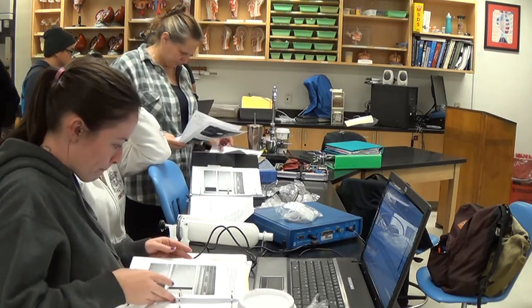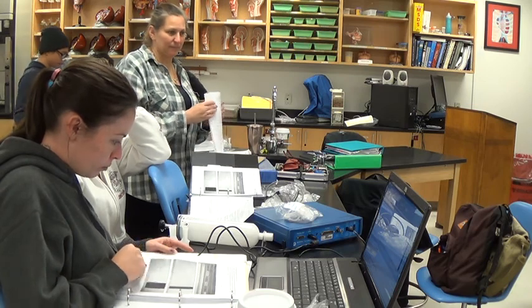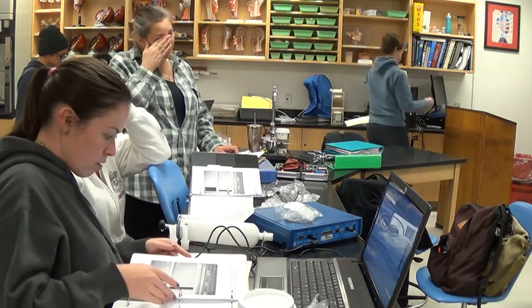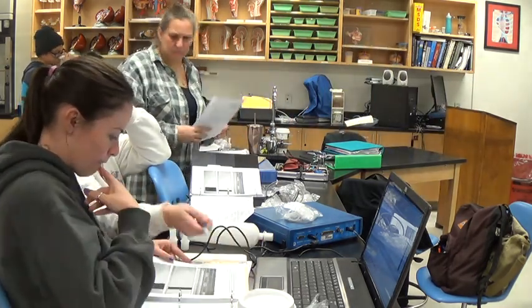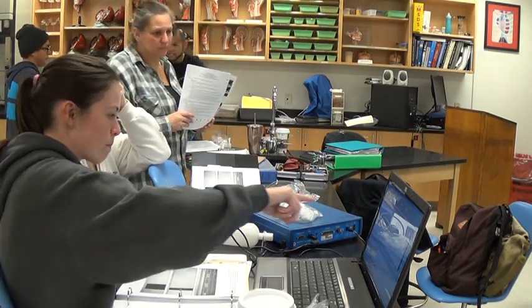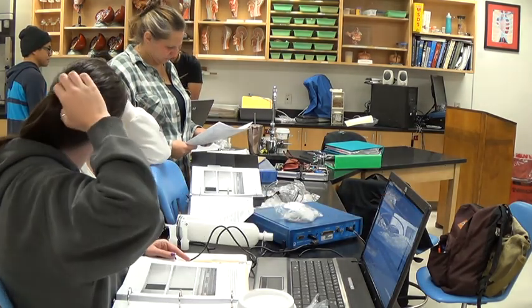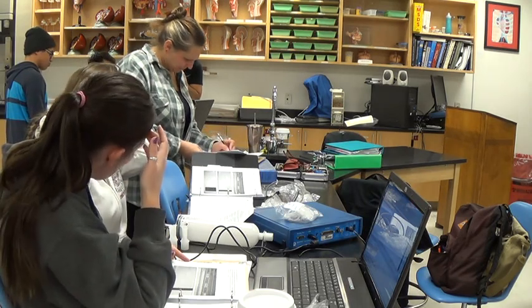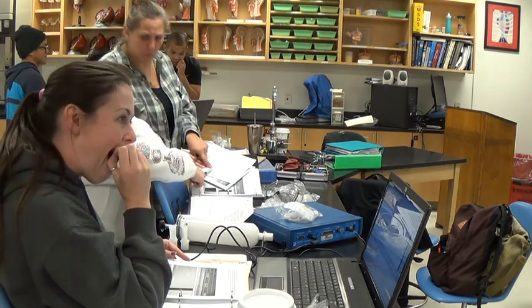Okay. Well, then you don't have any reserve. What does that mean? I'm confused. Well, when you look at the breathing pattern, it says here the vital capacity minus your tidal volume, 500, and inspiratory reserve. Vital capacity is 2914. These two numbers, the subtracted number from C, will give you D. She gave me 4.27.